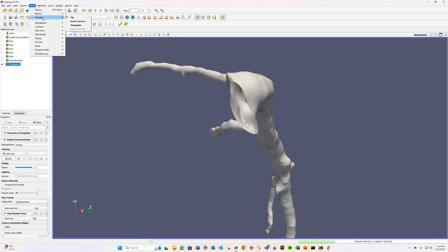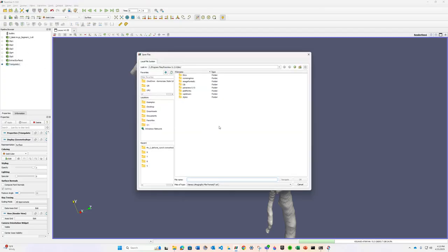But the more you do this, you're going to want to save them into your favorites. Like that. Once you're done, hit Save. Go to your folder. I'm going to call this FFR2 clipped test just because it's for the video, but I would just name it clipped like what you see here. And you know you're saving it in the correct format as STL.